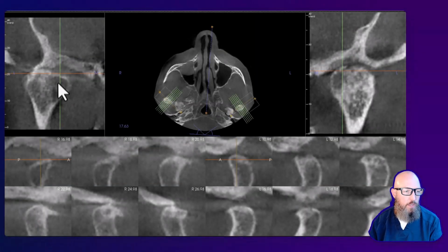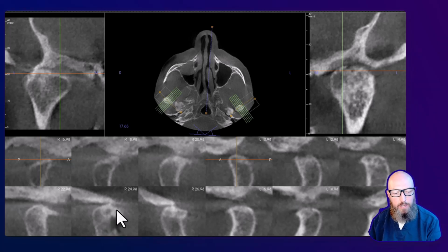All right, and then this one, see how the medial pole just looks more radiolucent? We also see what looks like little surface erosions, and then this one becomes more apparent. And here I like when you see this, when it looks like a chicken, that's just osteoarthritis. Could be other forms of arthritis, but you see changes of arthritis because you see that anterior osteophyte. What looks like the chicken's eye right here would be what? That's a subchondral cyst. Loss of joint space.